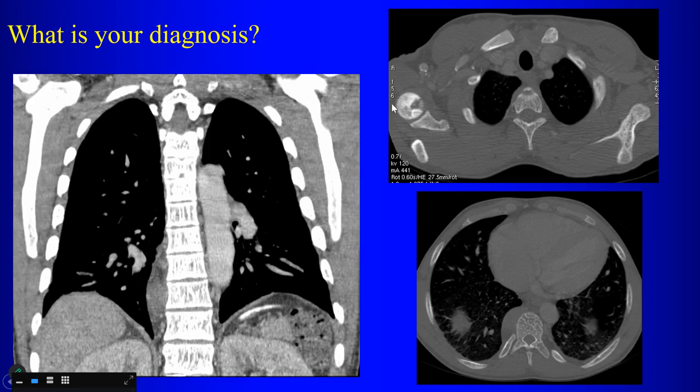Notice the sclerotic looking bones. And then here within the humerus, you have avascular necrosis. So avascular necrosis of the humeral heads, also a common finding associated with sickle cell disease. Often on the plain film, it manifests as sclerotic humeral heads. Okay.